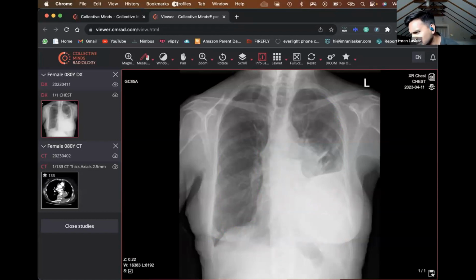But here, you can't really convincingly see any radiolucent lines anywhere. It all looks very uniform all the way along, right? As well, when you go to the corner, you can see it's lipped upwards like this. The next time you're having a cup of water, you'll see that the water lips up at the end, and that's called the meniscus or meniscal sign. So this is all supporting the idea that this is an underlying pleural effusion. There's some fluid sitting within the bucket over here.